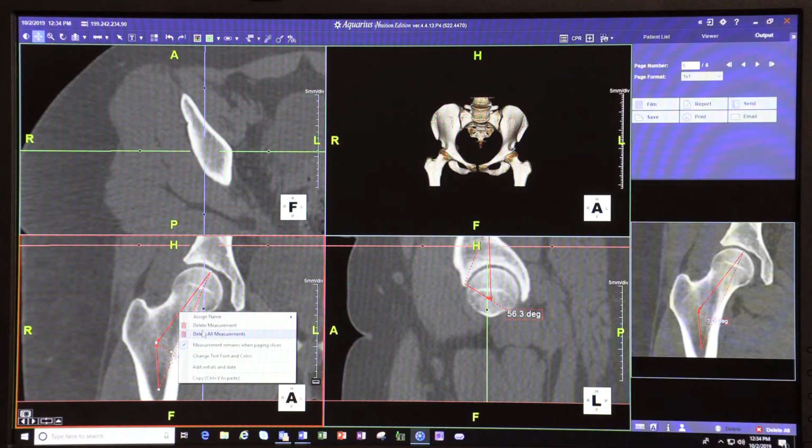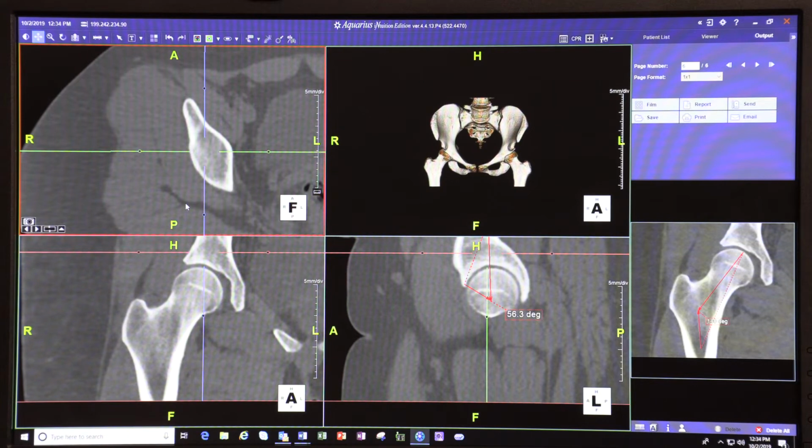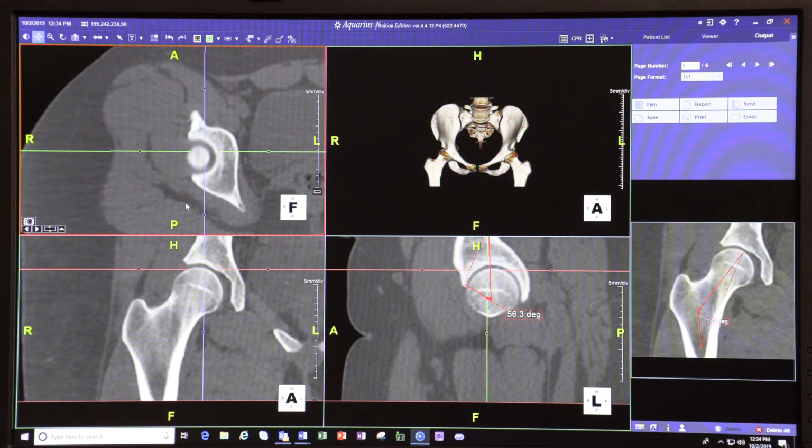The next measurement we'll go through is the femoral version. Now for the femoral version, ideally it should be correlated with the knee version as well. And I'll show you the knee image later. Maybe we can skip to acetabular measurements first because they just require this format and we can do it without the knee image in the plane.